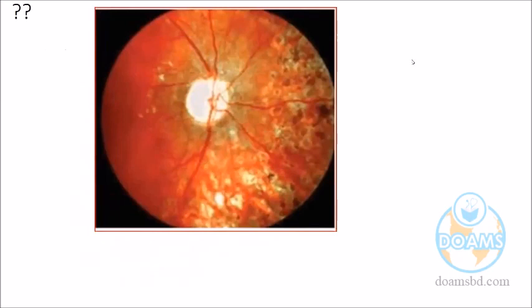So what is the appearance telling you? The vascular damages are there. So there is optic atrophy, right or wrong? Optic atrophy. The white retina. But our attention is towards the retina. What is the diagnosis of the retinal changes? Sir, retinitis pigmentosa. Photocoagulated, laser photocoagulated retina. Why not retinitis pigmentosa, Dr. Mahabub?